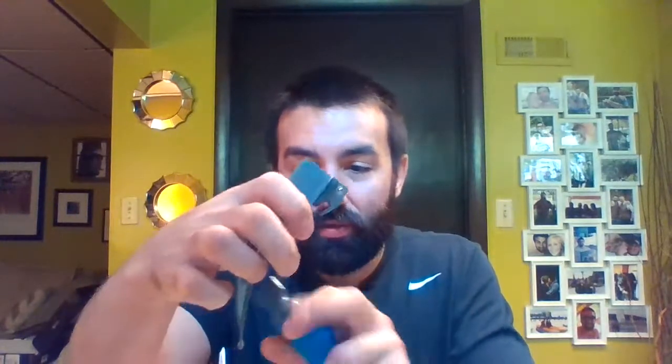On this handle here, you can see that metal bar. All the handles are the same. You're going to take those grooves. That bar is always going to be facing towards the tip of that curve. You push until it clicks, lock it in place, and then check to make sure that it lights up. I check it, get it all ready, and then unfold it like that and leave it locked on, but I'm not using up my battery source. That way, when the doctor's ready to intubate, click it in, and you're good to go. This is something you have to ask the physician who's intubating.